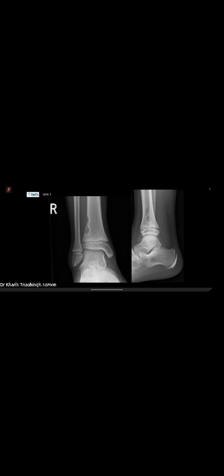Okay, can I ask you just to tell me if you think this is aggressive or non-aggressive first? It has caused a bit of deficiency in the cortex, but based on the location and appearance, I would still designate it as non-aggressive. Good. Okay, so non-aggressive. Tell me what you know about an osteoid osteoma. Why do you think this is an osteoid osteoma? It's based on the cortical location, but it's not that diaphyseal. Yeah, my second differential would be a non-ossifying fibroma. Okay, good.